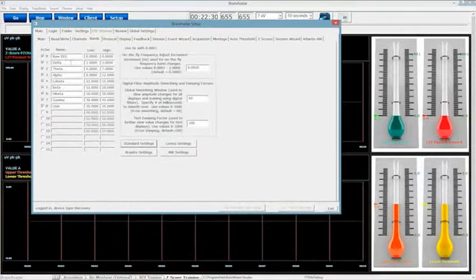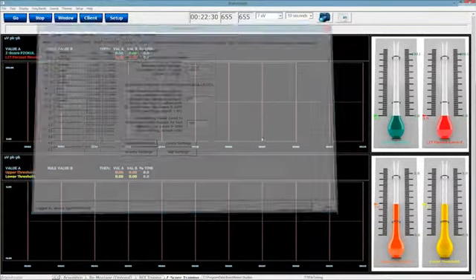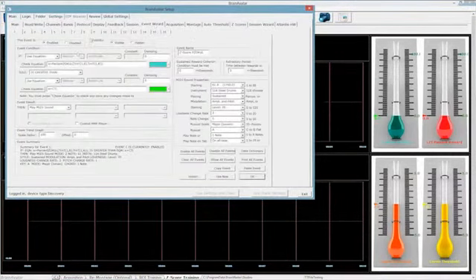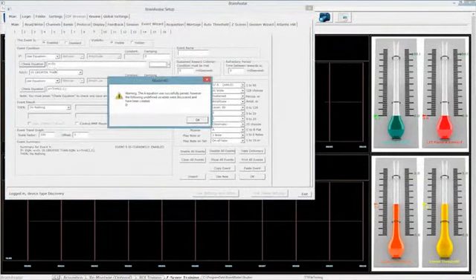So if I go to the bands page right here, most of you might know the bands page. This is the page where you get a lot of customization on what the filter band ranges are, as well as what their names are. So if I happen to change the variable, I have now changed this variable. I've said, you know what, I want my first band to be the webinar band. Well, now I have changed the variable and the software does not know what D is anymore.